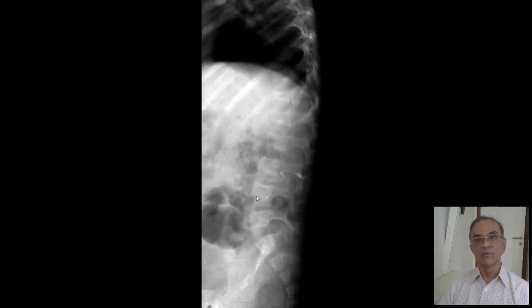Now, this is not a dysplasia, because there's so much osteoporosis, and if you look carefully, the bone density is abnormal. The trabecular pattern is abnormal, and this is a child who has platyspondyly with abnormal bone texture and abnormal bone density. If you want to call it a dysplasia, call it a dysplasia, but this is classical: platyspondyly with abnormal bone density, which is less. Platyspondyly with beaking and normal bone density is an MPS.